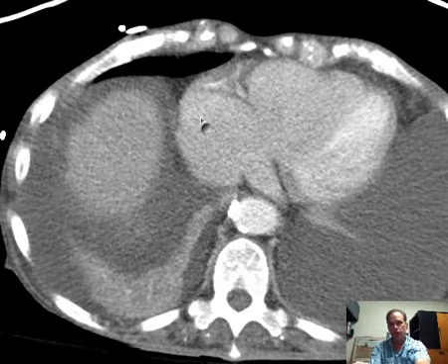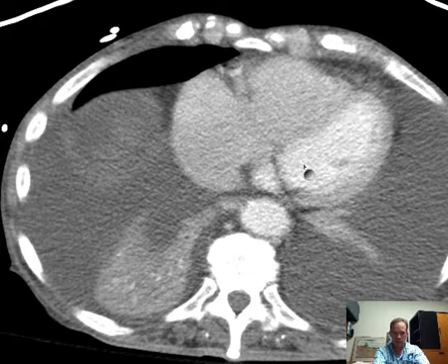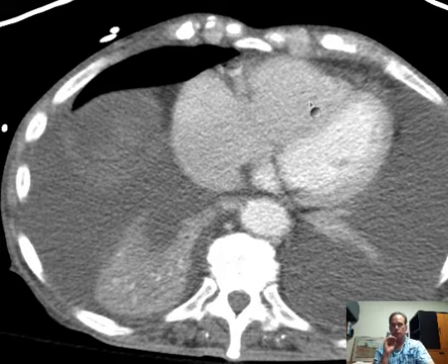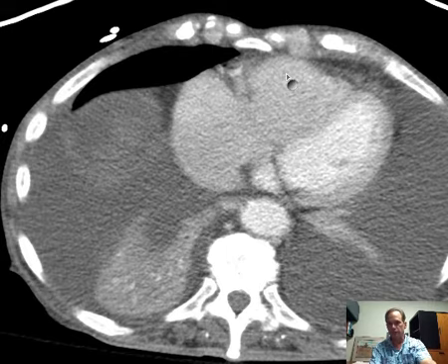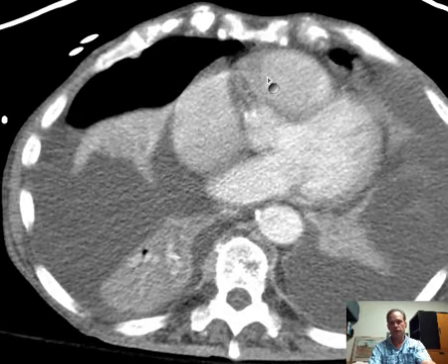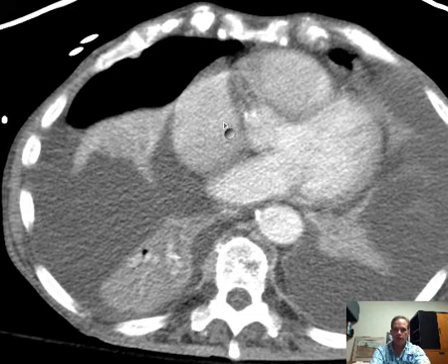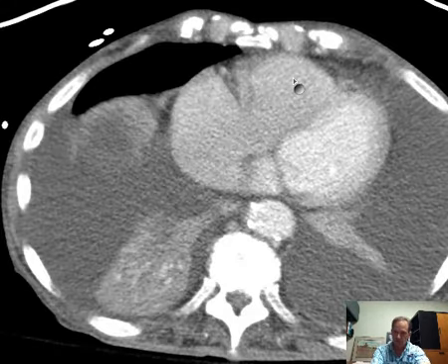So again, if we look through this heart and we say left ventricle, it's not because the contrast is brighter there, that could depend entirely on how long after the injection we did the imaging. So this is left ventricle, this is interventricular septum, this is right ventricle. Left ventricle has thick muscle, right ventricle does not, and it is more rightward and more anterior. Then you know that these chambers here, these two, correspond to atria. The left atrium goes to the left ventricle, the right atrium goes to the right ventricle.